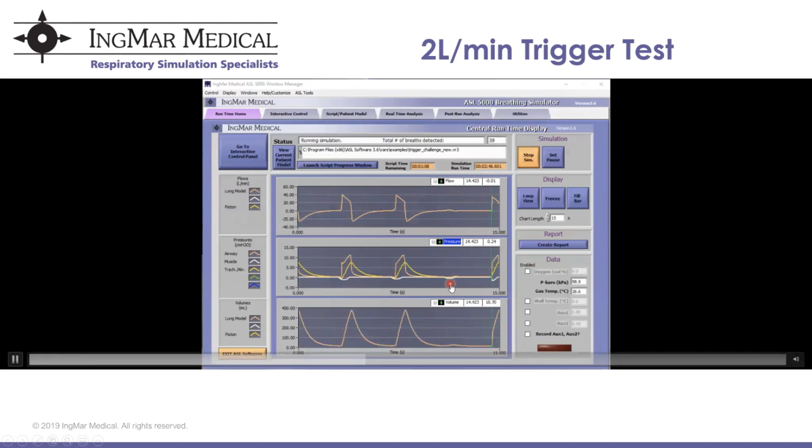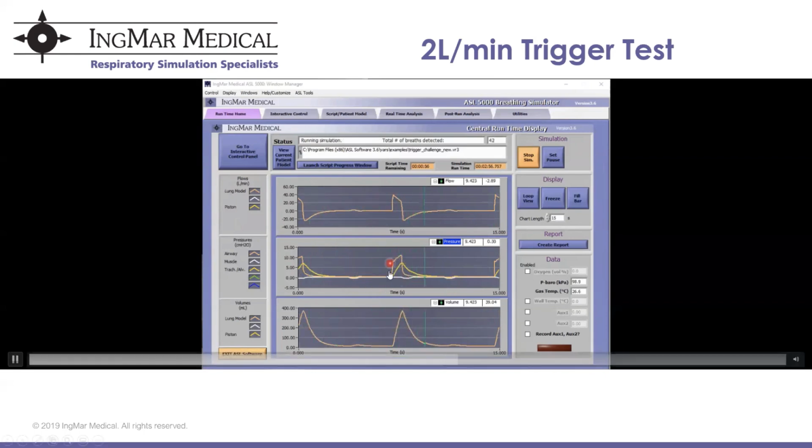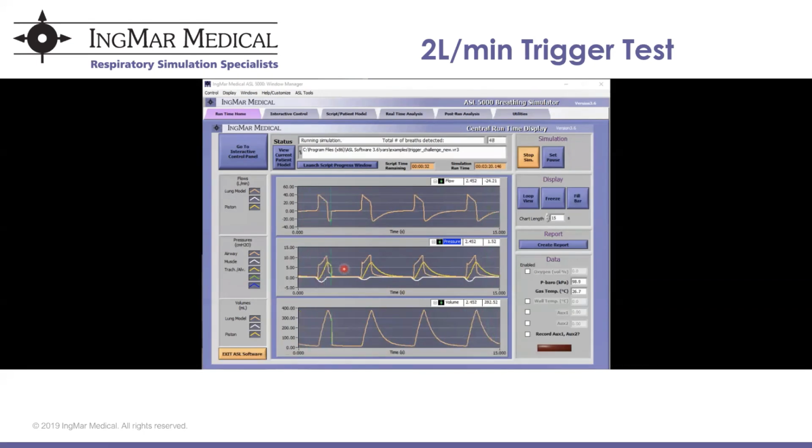Interestingly, you can now see some kind of synchrony, but we had a breath rate of 8 set as a backup on the ventilator, and therefore the ventilator is not responding. It's actually just coinciding. And here you can see the ventilator actually triggers, so to speak, before the patient makes an effort. So that's definitely not triggered. Here we go again. After a couple of breaths, the response of the ventilator. Now we are back in business and the ventilator is responding.